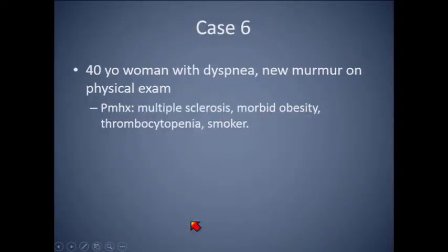And it's interesting, so for severe aortic stenosis cases, that's one of the things that even if we saw delayed enhancement on his MR, they will still replace the valve, still think they're going to get better. Give them the opportunity to get better, because a lot of them will still improve even if they have some scarring. All right, this last case, one more odd one.